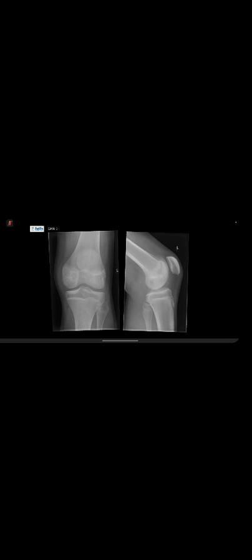This is a frontal radiograph of the left knee, and AP and lateral radiographs. Following the cortices of this immature skeleton, I see through the cortices of the femur that the cortex is continuous and complete, and following the tibia and fibula.